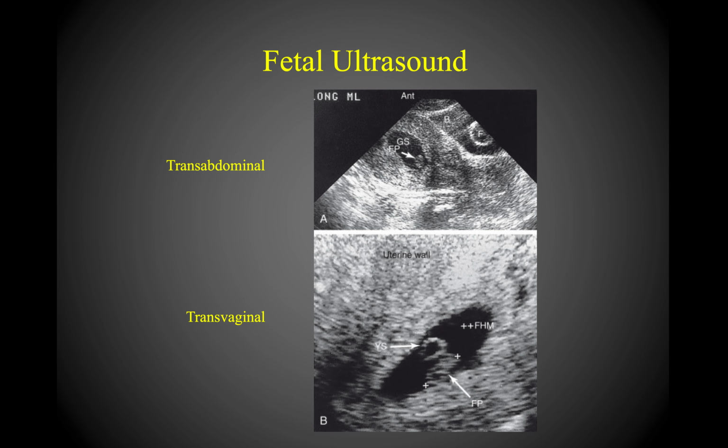Okay, now we're going to just finish up with fetal ultrasound. So these two images are one's transabdominal, one's transvaginal. So the ultrasound is actually the primary method we use now to assess female pelvic viscera. There's a couple reasons for that. Number one, it's cheap and easily accessible. It's also, there's no radiation, so there's a significant risk with pelvic radiation in females.